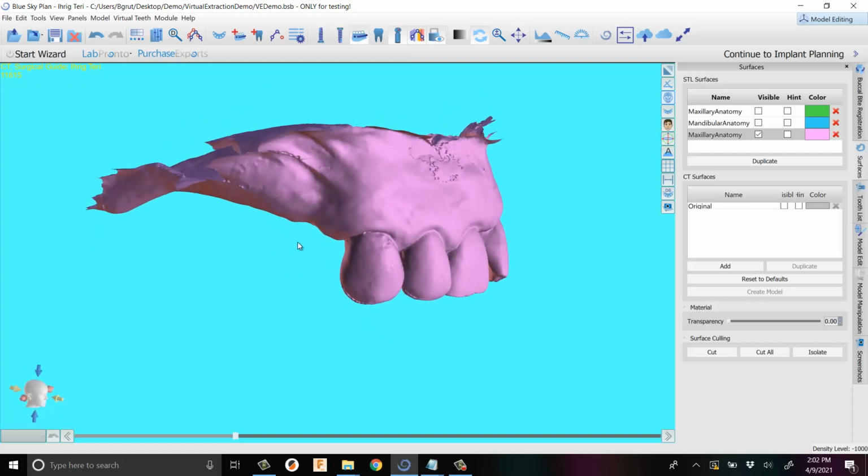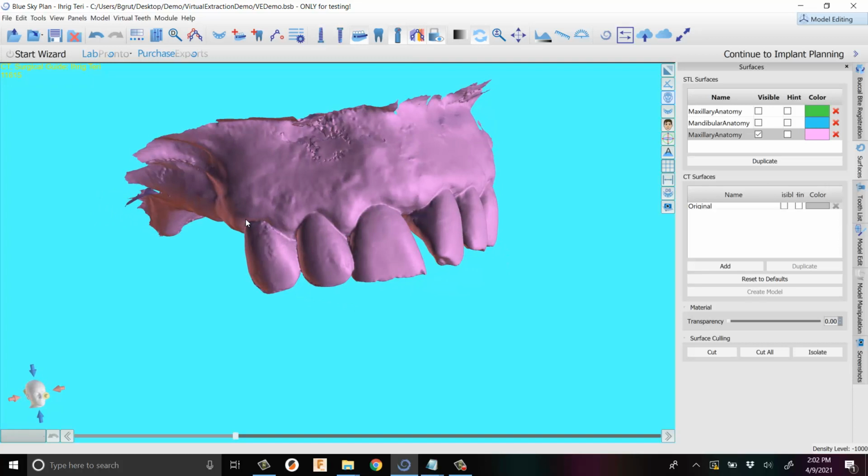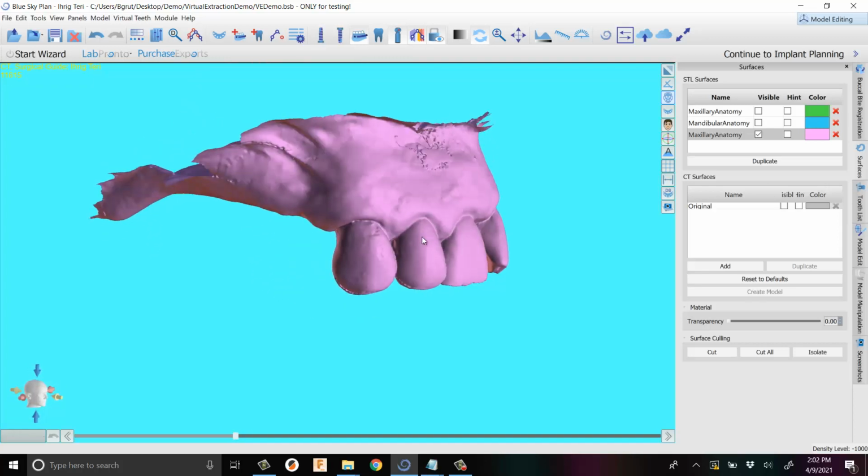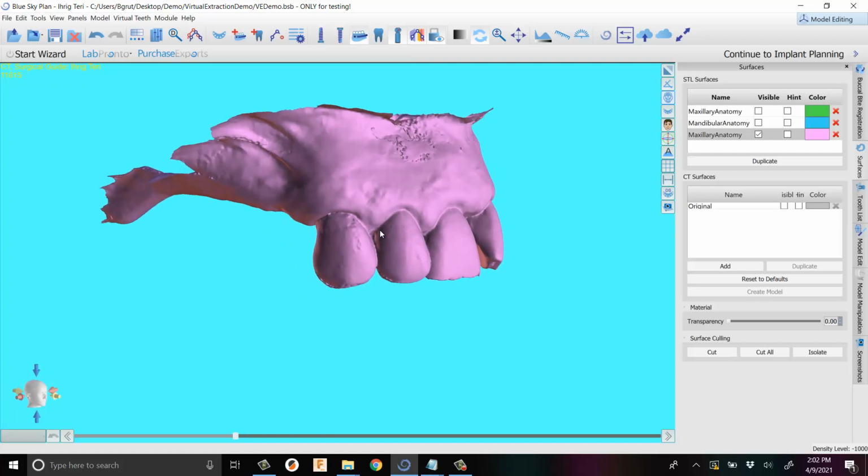And you might be wondering, well, geez, that doesn't work anymore. Where'd my cut tool go? It is still there. The problem is that sometimes it'll cause people to have issues and things will get cut that they didn't mean to.